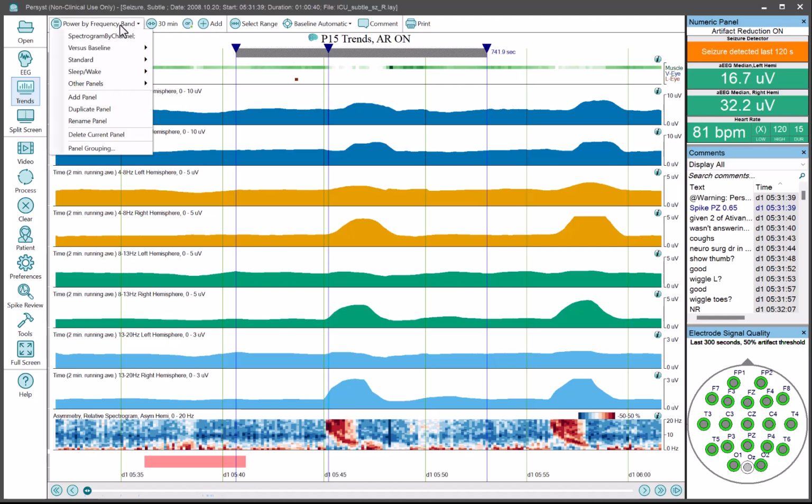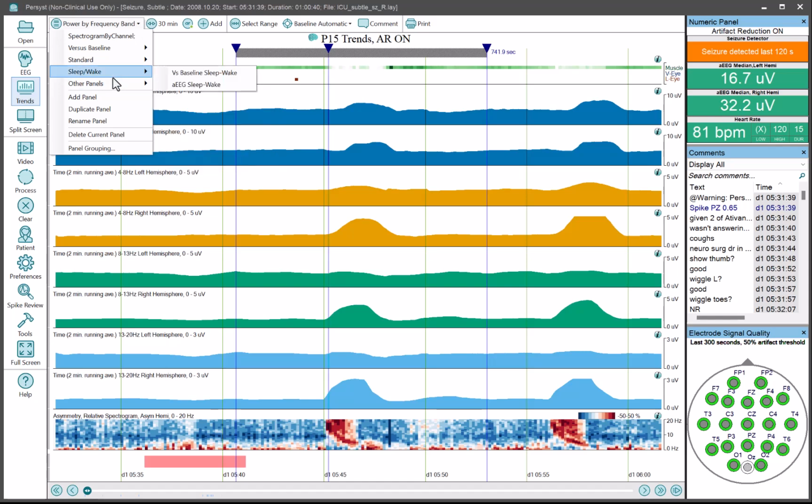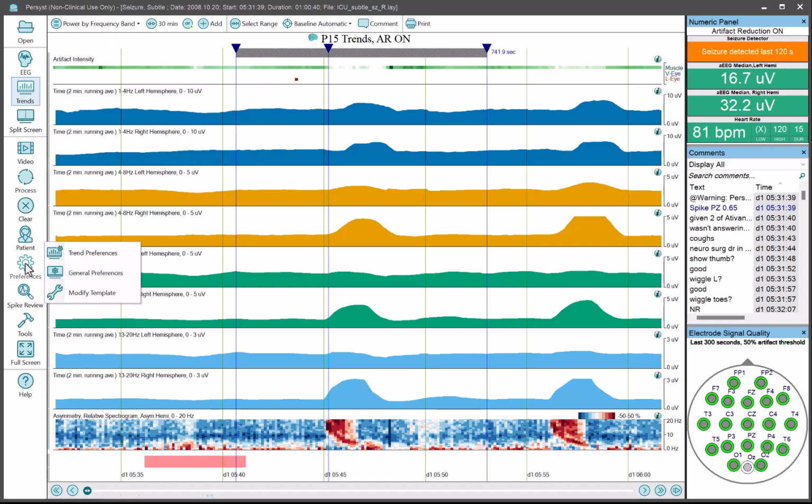Let's go ahead and create a new panel. And again, I'm not saving this trend panel add. If you wanted to save this work, you go to Preferences, Modify, you clear the trends, Modify Template, pick your starter template, the default trend settings version P15 or P14.mmx. Make your changes, save it as a new trend panel, and then you can apply it over and over again. But I'm just showing you how to do the export. So I'm not going to bother with this.